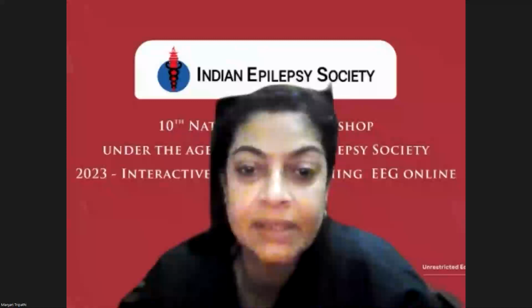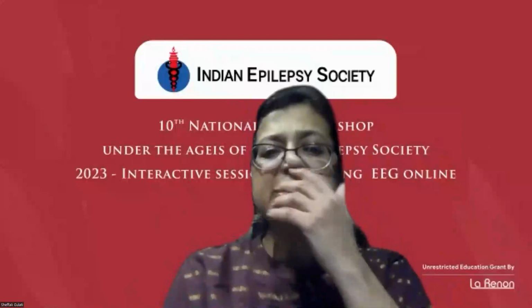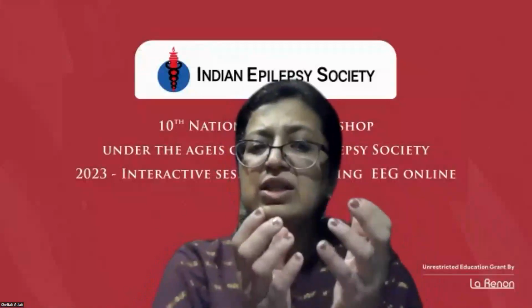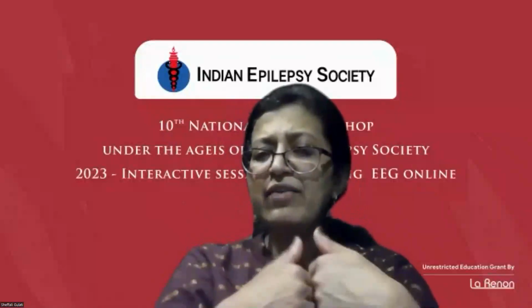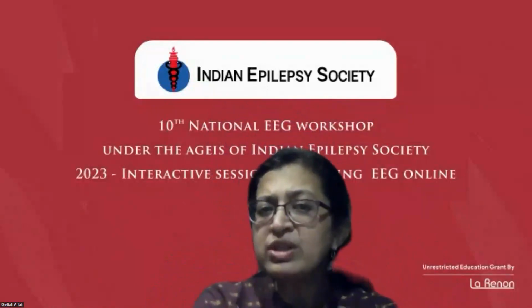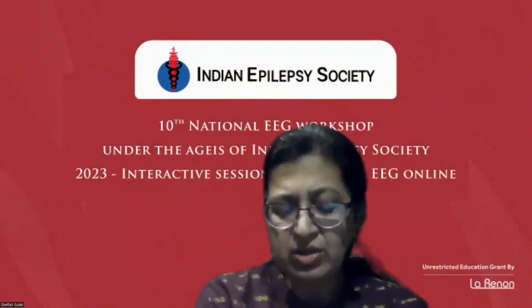What is the difference between a burst and a discharge? Why not just call it discharge and suppression? Why call it burst and suppression? See, what you define as a burst is basically not one discharge, it is just coming and coming. It is called that because it is characterized by the features within the burst and the suppression, and the contrast between them. You have high voltage activity, around 200 microvolts, and then you get a suppression. It is the contrasting thing, and that is why they call it burst suppression in the definition, not only the discharge.